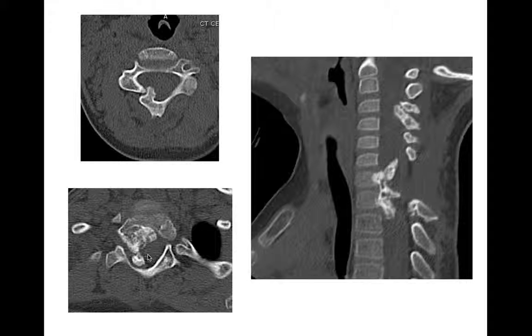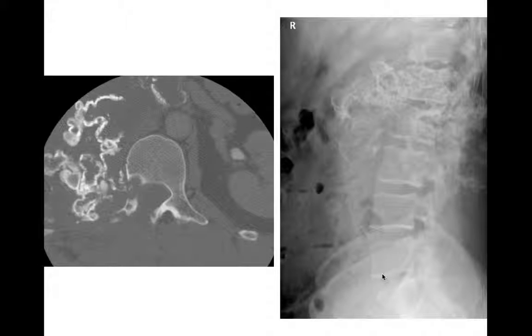It's shifted over here, and this was a child, and they had multiple hereditary exostosis, and they had this lesion. They've had some surgical resection back here from prior treatment, and this was causing neurological symptoms. So not a common place for osteochondromas, but they can occur there. We saw the one on the scapula, just to show you that.